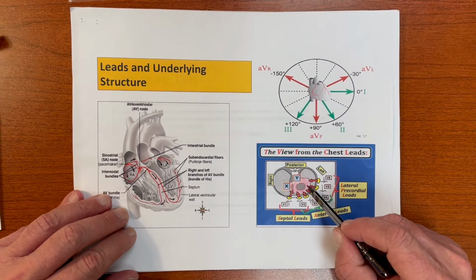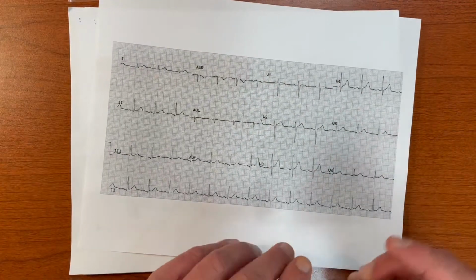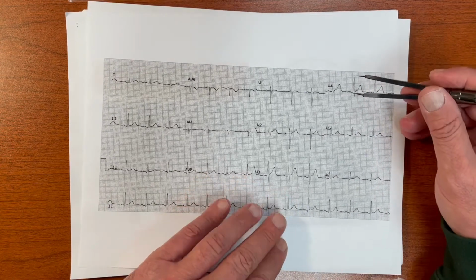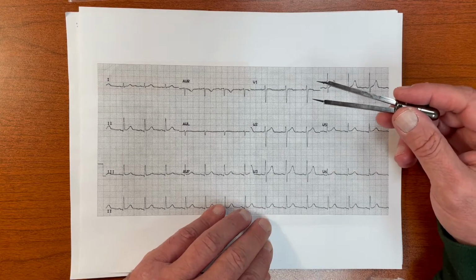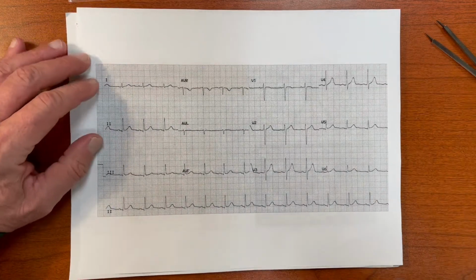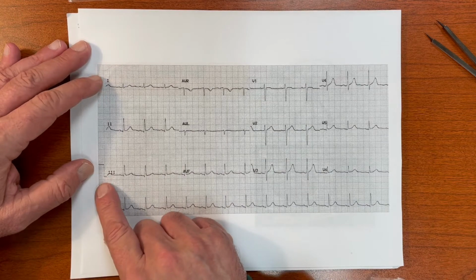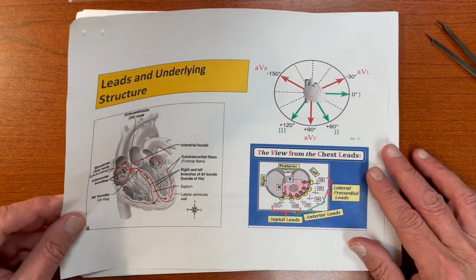As the heart muscle gets thicker, there's more muscle to depolarize, and that means the R wave gets higher. So the R wave now must become very important for us to measure so we can determine is there LVH or not. Remember, we're doing this in the context of something we've done earlier in the process, which is making sure that our standardization or calibration is okay. So this is what I like to do.